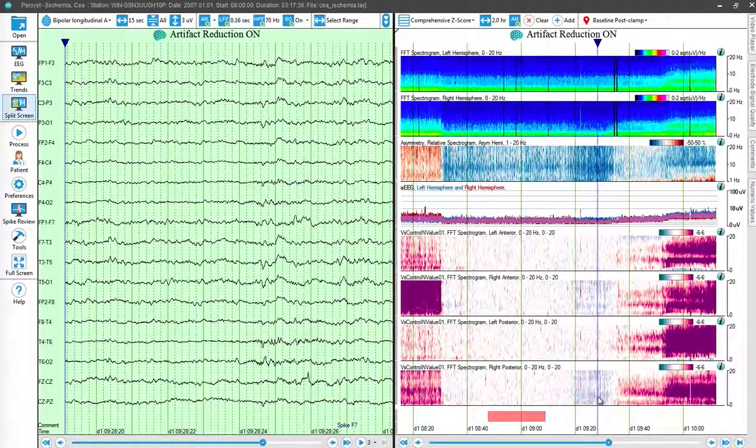So the idea is that longer recordings, very long recordings, 24, 36, 48, 72 hours, even spanning recording segments, you can mark a baseline according to patient state, awake, asleep, post-ictal, wherever you go to mark, and you can calculate differences from that point, even if it was many, many hours prior.